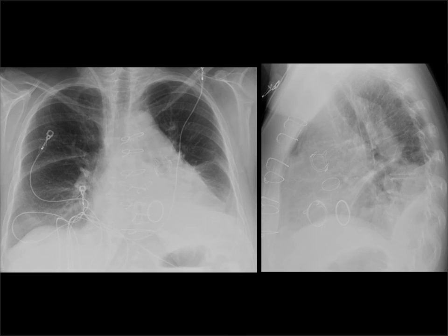And I was delighted when a colleague sent me this chest x-ray, where the patient had all three. Now, remember, when patients' hearts get really enlarged, they don't fall into exactly the places I drew on the normal diagram, but still, we have mitral, tricuspid, aortic, and pulmonic. I don't know if this patient got money off for having so many.